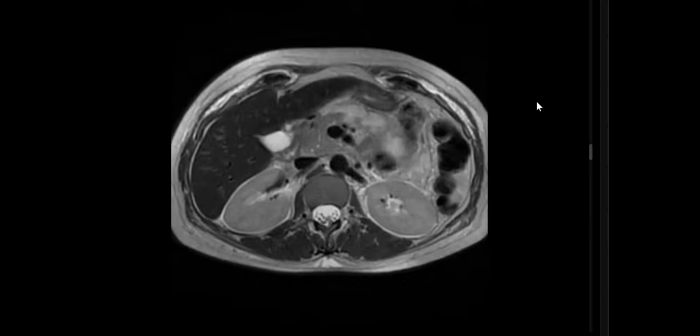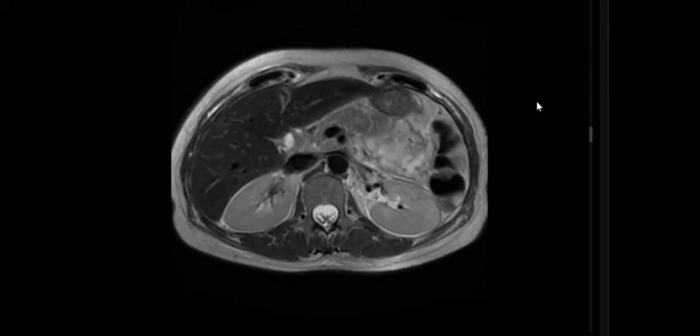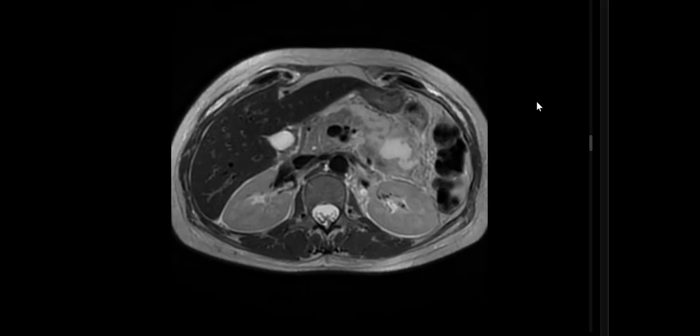I don't remember. I gave you this case maybe two sessions before. Acute pain in a pregnant lady. This is an important indication for MRI: MRI in pregnancy, acute abdomen. What are you looking for? The common causes of acute abdomen: any ovarian pathology that is caused during pregnancy, any red degeneration of the fibroids. Okay, this is gynecological or obstetric related, but sometimes not, like this case.